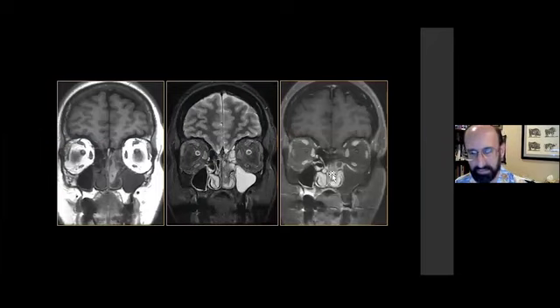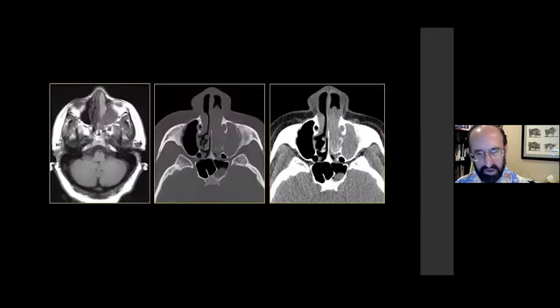And the lesion may be showing some contrast enhancement. Because it's bright on T1, it's sometimes hard to tell whether it's enhancing. You notice that the sinus secretions are just obstructed secretions. There's no enhancement. It's got the typical rim of enhancement of the mucosa. And therefore, even in the ethmoid sinus, we see that this is not enhancing tumor. So this signal intensity could be secondary to secretions, and we'll pursue that in just a moment.